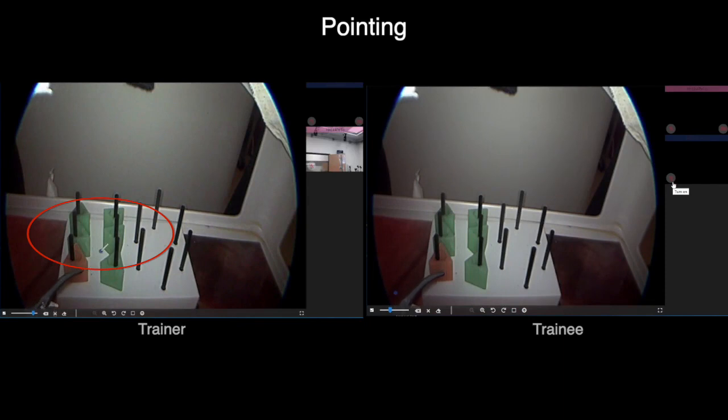Functionality walkthrough. Now that you have seen a demo of the system, you will see a walkthrough on how to perform each functionality. There are two main sets of functionalities for you, the trainer: pointing and annotating, and manipulating the view. Pointing and annotating. To point, move your cursor on top of the live endoscope video. The remote trainee will see this movement in real time.